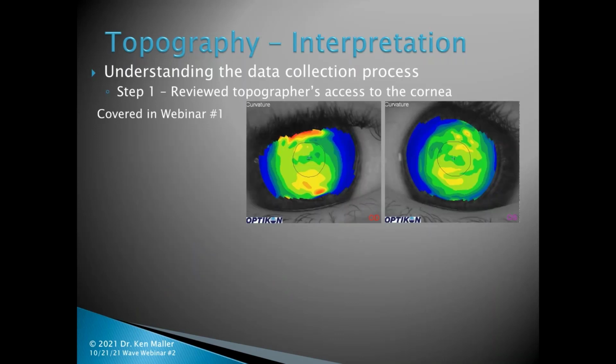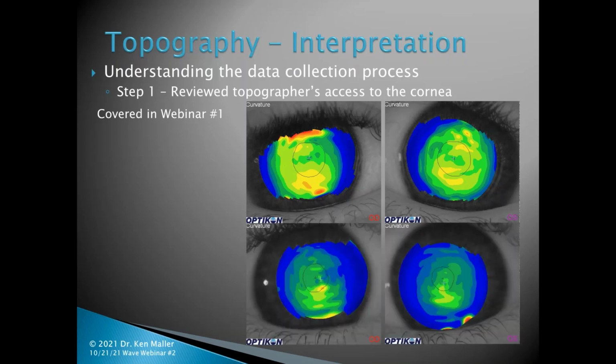Over here, we could see, again, on the right eye, the lids are sort of obscuring some of the data, and on the left eye, you might say that's actually not all that bad. We have this down at the bottom. The problem with this data was something entirely different. This is exactly the same set of eyes, both on the top and the bottom. And you could see that the top set of eyes are considerably steeper looking than the bottom set.